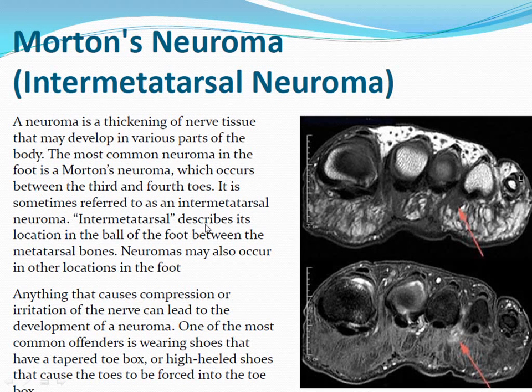Here's one reason you'll be doing imaging of the foot: to look for this Morton's neuroma, or intermetatarsal neuroma. It's just a focal thickening of the nerve tissue that you usually see between the third and fourth metatarsal heads. This is something that you may notice on physical examination, because the patient will have pretty localized tenderness, so maybe ahead of time you'll know that's what they're looking for.